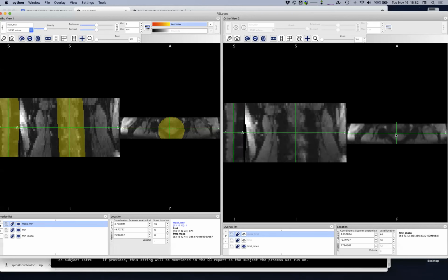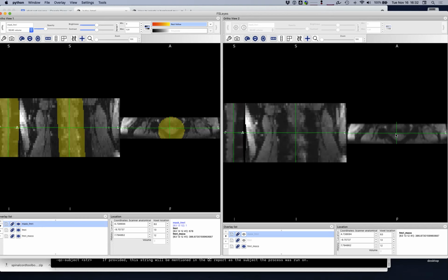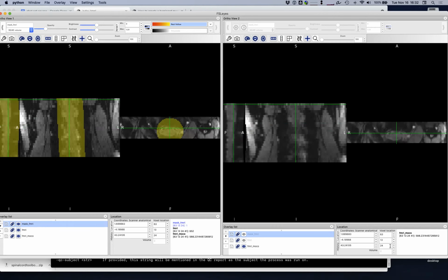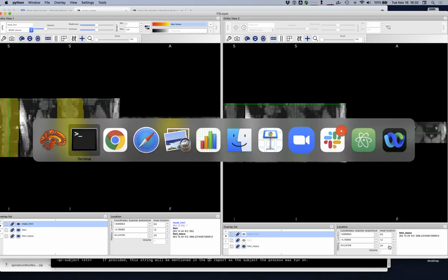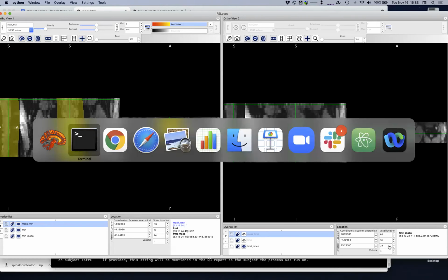Okay, I'll try it later. Yeah, that's actually nice. Sandrine, maybe could you add a note to this, that we should actually discuss this problem of registration and then discuss what are the mitigation strategies for this. So we talked about increasing the mask, changing the metric as well. So you have cross correlation and sum of squares, those two.